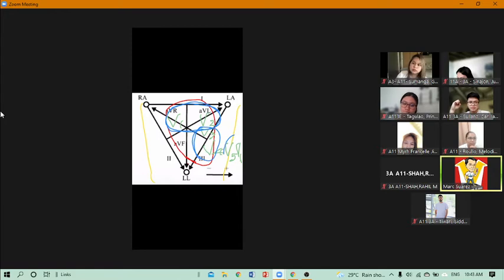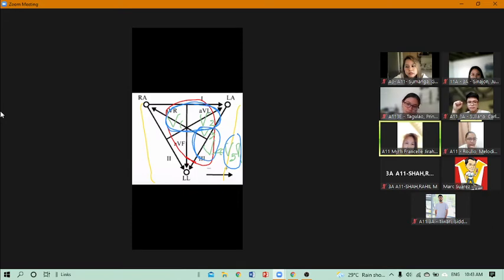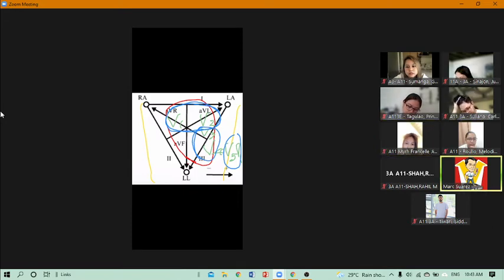So V5 and V6 represents a little bit of the left ventricle and a portion of the right ventricle. So it is not so clear, it is ambiguous or equivocal. However, since it is placed at the sides, we can label it as lateral portion, right?